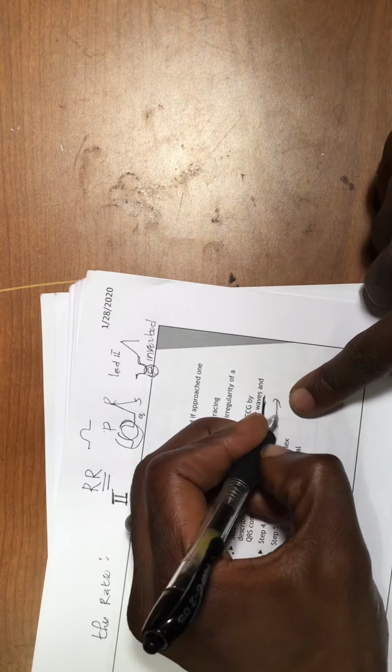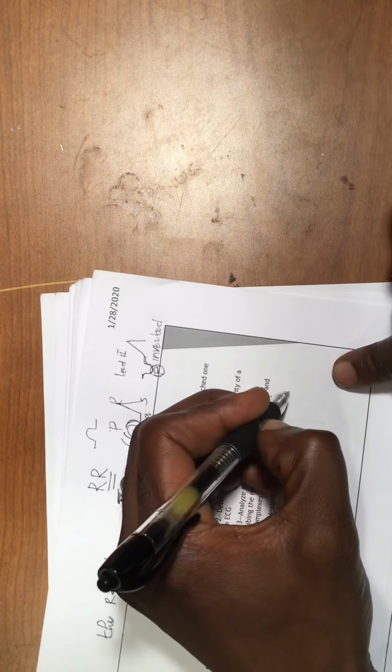So how do you do that? You need to measure your PR interval, because in second degree type 1, your PR interval is going to be different from one QRS to another QRS, until it drops again and so on. So it's really important to know about it. This is the reason why first I want you to know how to measure the PR interval. We're going to be doing some practice on the PR interval.